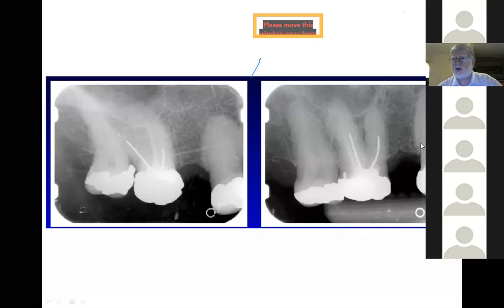You can just make out where the tooth may have wanted to be. And then you've got all this hypercementosis again. Looks quite different in another view, but yeah, extremely poor endo, but no periapical pathology. Why is that root filling and that root filling looking so much brighter than the other root filling? The general consensus seems to be silver points. Very good. Excellent.